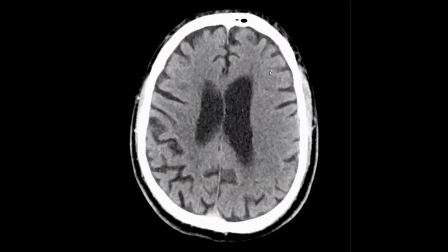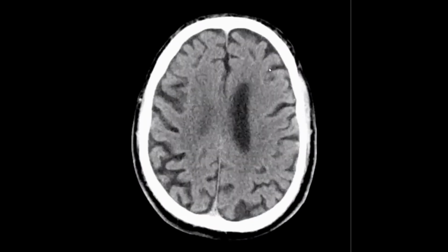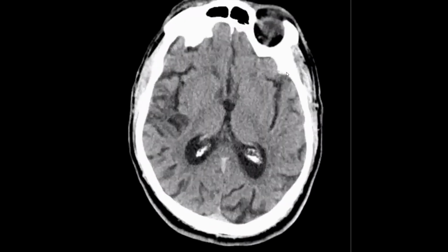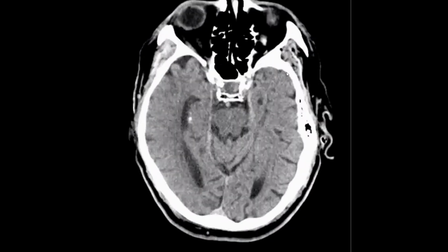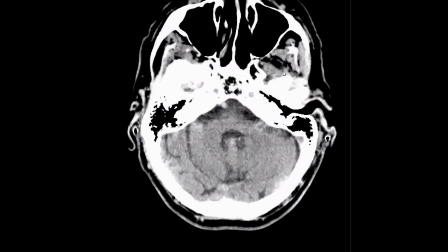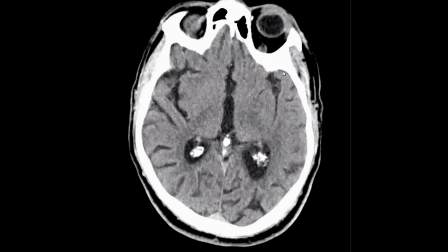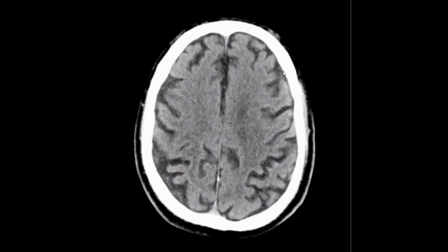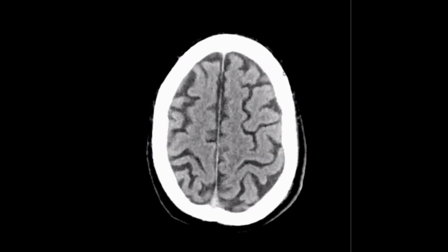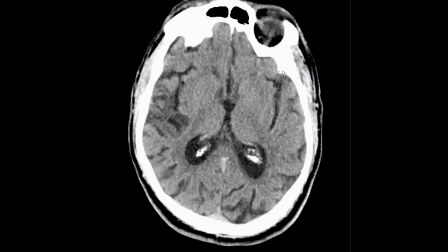We have acute deterioration of consciousness. I'm checking if there is any hypodensity, but I can't see any, so there is no evidence of acute infarction. Let me check the blood vessels, very important. Before that, I think you excluded any hemorrhagic insult. Yes, there is no hemorrhage.